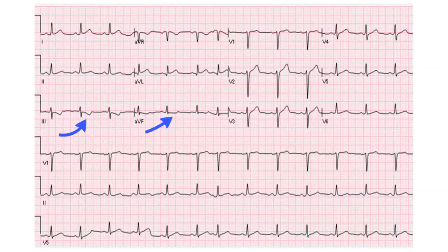It does look like you've got ST depression in those leads, not as marked as the previous one, but having seen it, have a very careful look at the high lateral leads. Look at AVL just here. And once again, you can see that there's ST elevation, not so much T-wave peak. I mean, the T-wave is more than half the size of the QRS complex at least. So it looks a little bit peaky, but there is some ST elevation as well. If you draw that line, it's clearly not as marked as in the previous ECG, but it is up compared to the baseline. That is a high lateral STEMI.